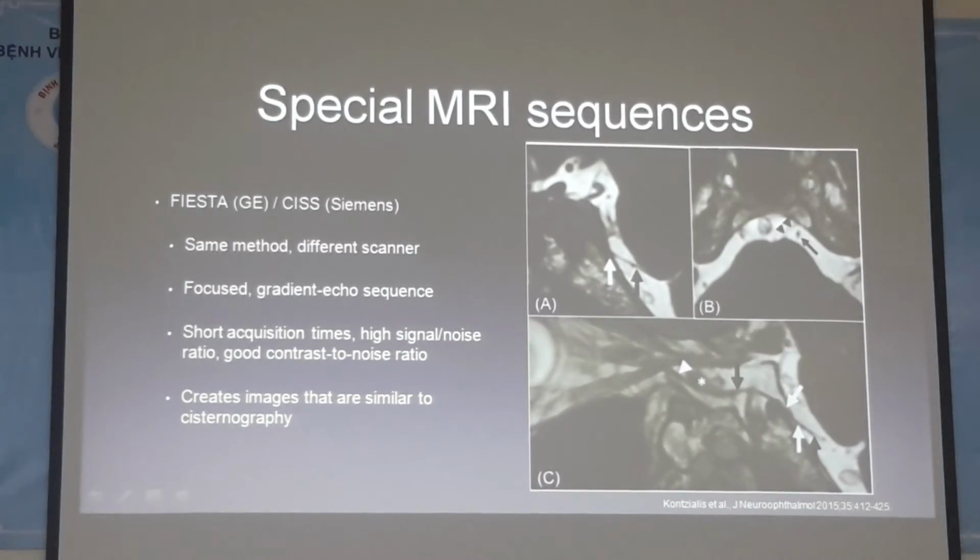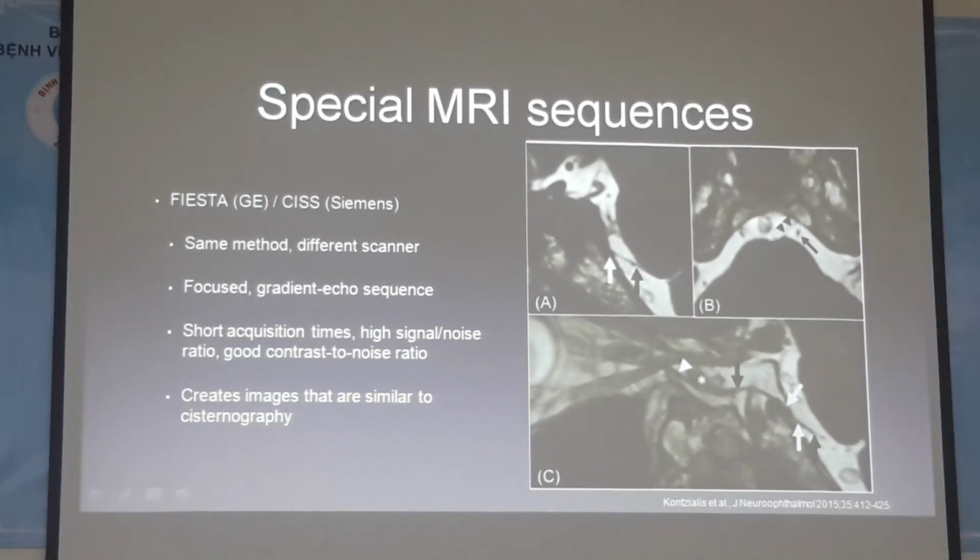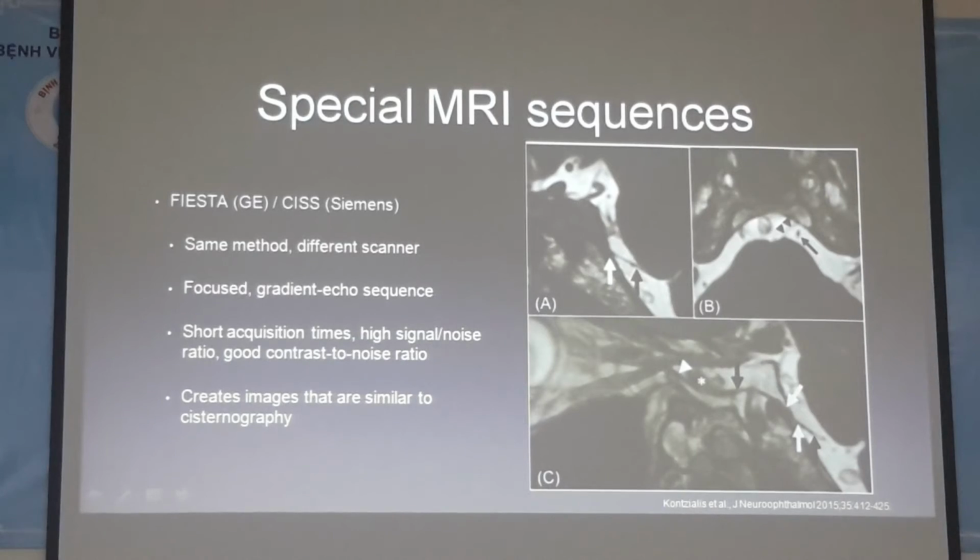And the image in panel B, the arrowheads show the dividing septum between the prepontine cistern and the cerebellopontine cistern, and the black arrow shows you the sixth cranial nerve. Again, in daily practice, that may not make a difference, but if there are tumors that are sitting in one area or another, if we know where that tumor is sitting, we then can know if that is likely to press on that sixth cranial nerve and cause an abnormality in our patient.